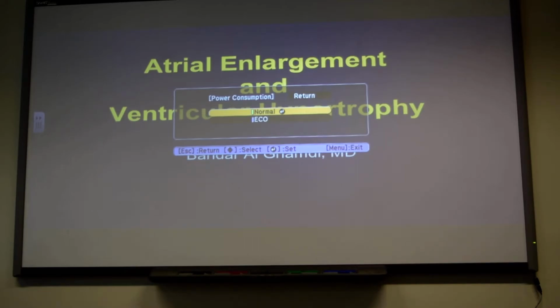Sinus bradycardia, atrial fibrillation, atrial flutter, SVT. These are the common rhythms that you should remember. Today we'll talk about atrial enlargement and ventricular hypertrophy. What is the difference between enlargement and hypertrophy?